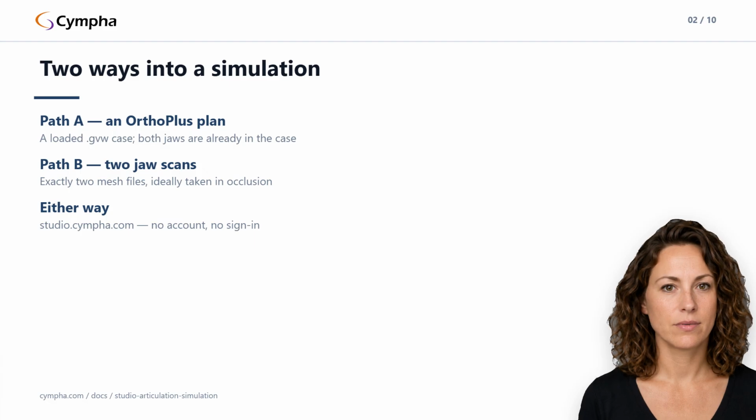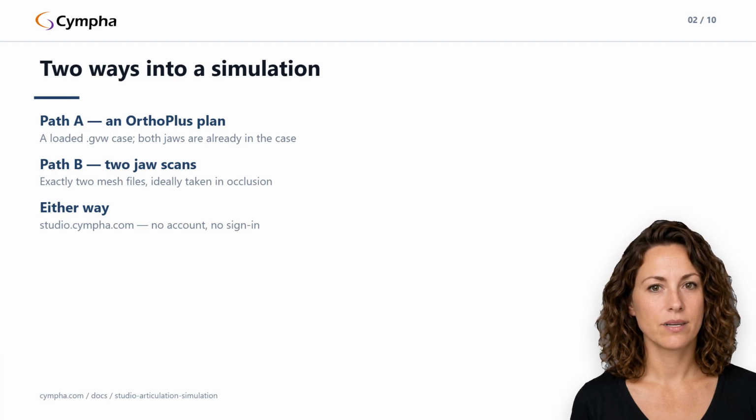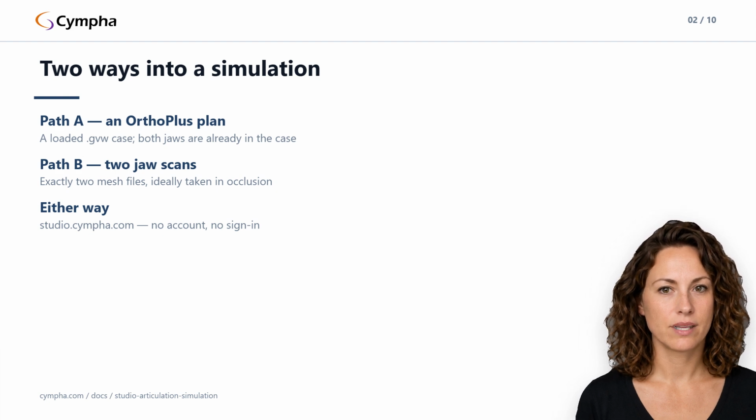Door 2, two standalone jaw mesh files, typically an upper and a lower arch from the same patient, taken in occlusion or close to it. Those are the only two ways in: a case, or exactly two meshes loaded through the dedicated menu item we'll see in a moment. Everything happens at studio.cympha.com, and nothing in this workflow needs an account or a sign-in.